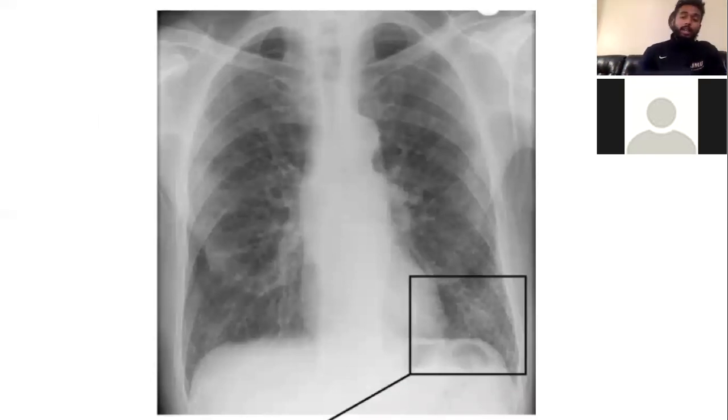Fibrosis, at the end of the day, to me, just looks like a staticky X-ray, man. It looks like old school TVs with antennas where it's staticky and the picture's not clear. That's what fibrosis is. It looks almost like you get this thin veil over it, and it has this mesh-like look to it.